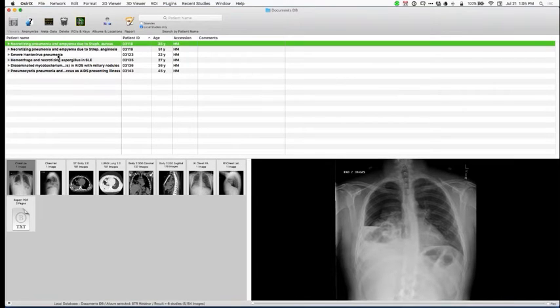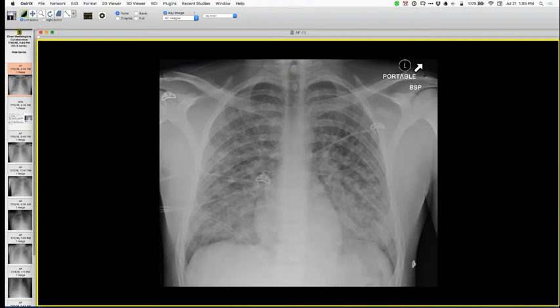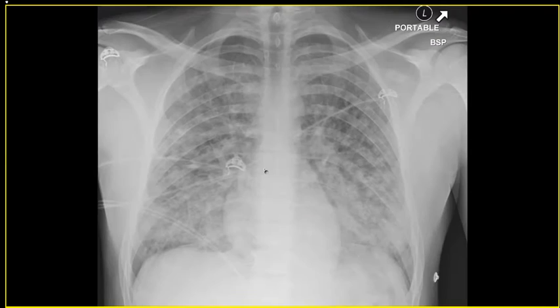All right. This one is particularly interesting. It's a new patient that we had just the other day. So this is a young person that has a radiograph that looks like this, and I'm withholding some information for the moment, but clearly he has bilateral diffuse multilobar opacities.